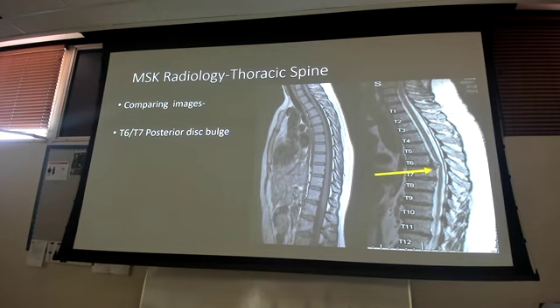And yes, for those of you that are looking, there are some tiny ones at T10, T11, and a little bit of T11, T12. On the test, you wouldn't say herniated, you would just say disc bulge? Either, it would be one or the other. Herniated disc or bulging disc, for this course, one and the same. Good question. If there's bulge and herniated on there, which they really shouldn't be in the same one, it's not trying to trick you, they're the same. Pay attention to the locations, that's where the real answer is.